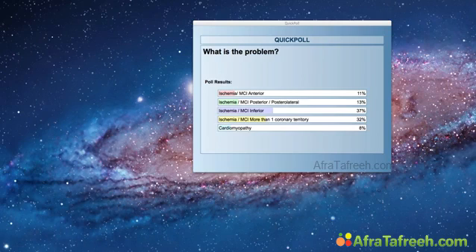I'll show you first of all what I thought when I saw these images. Well, this segment here for me looked quite suspicious. You see that there is not much wall motion here in the basal inferior septum, so I was actually thinking it must be something that has to do with the right coronary artery, or is probably a problem of the inferior wall. But then again, if you also look at the anterior wall, it doesn't seem that the wall motion is normal here in the anterior region as well. And then look at the motion here. There seems to be a hinge point. Maybe the apex has a problem as well.